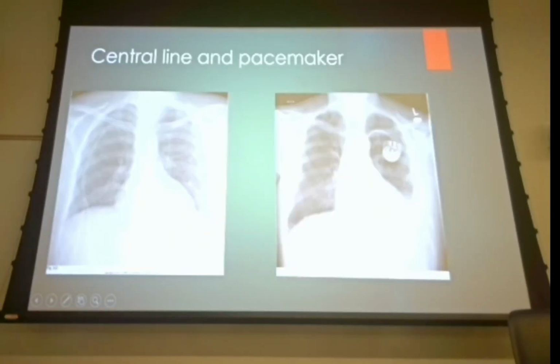for chest tube placement. So central line placement, we've got a couple of things to consider. One is, in the best case scenario, we want the central line to go down and stop somewhere around the right atrium, right? Sometimes if it's central line, it'll actually go upwards instead of downwards. And your doctor may decide to come back in and pull it, put the guide wire back in, pull it out, and try to get it to go in the proper direction.